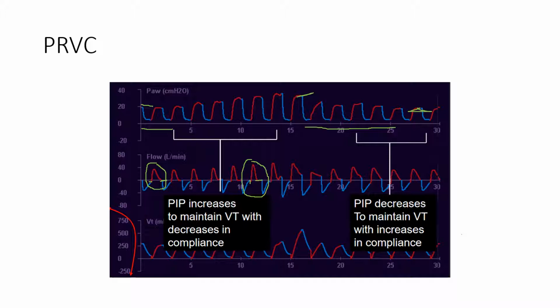Look at that, it's continuing even longer after it's returned to baseline. So what's causing that? Well, the inspiratory time is just too long. The patient isn't being allowed to exhale when they want there. But then you notice as the PIP starts to decrease, the flow waveform starts to normalize again and the I time seems more normal.